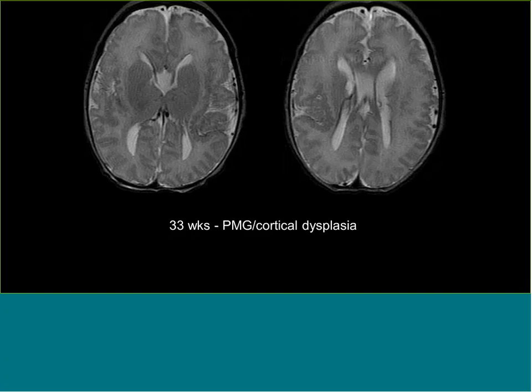And I'll show you the postnatal images of this same patient. And this patient also had a callosal dysgenesis, which is why the ventricles are a little peculiar in shape. But again, you can see this extensive polymicrogyria almost looks like cobblestoning in some areas, and just very extensive cortical dysplasias, to which we were blind at the 21-week imaging. So this is clearly a limitation of just the nature of the process when we look before the sulcation starts. Is that good?